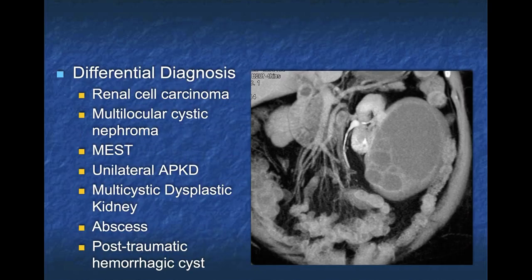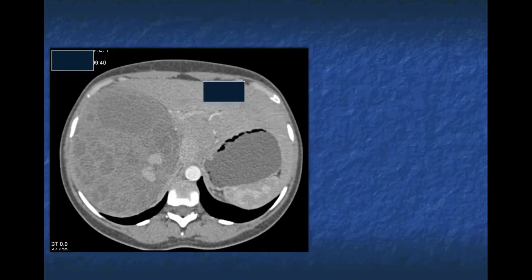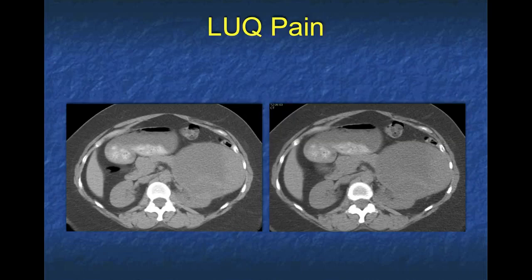But again, that differential diagnosis, I'm always worried, of course, about a cystic renal cell carcinoma. But in this case, as you know, and as we said, it's a minimum Bosniak 3, and the lesion is coming out. Okay, no problem, a MEST tumor. And here's another MEST tumor right here, a large cystic lesion, cystic and solid components, kind of looking exophytic and well-defined. Again, if you've seen this, Linda Chu wrote an excellent article. It's worth reading. Really great case.